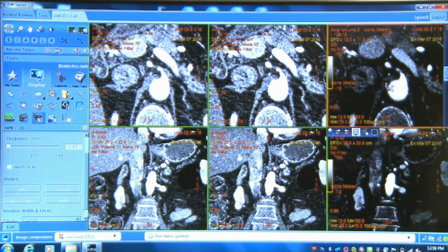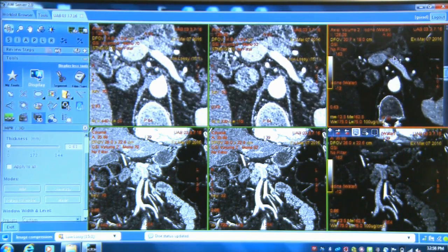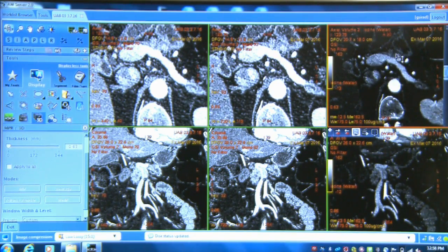This is the worst this image is ever going to look, and it actually looks pretty nice. So what we want to do is look at the anterior margin of that tumor to see if it's spread beyond the pancreas. And I think the iodine images show it best. This actually was a 1.3 centimeter, but T3 lesion, meaning that it had entered the extrapancreatic fat.